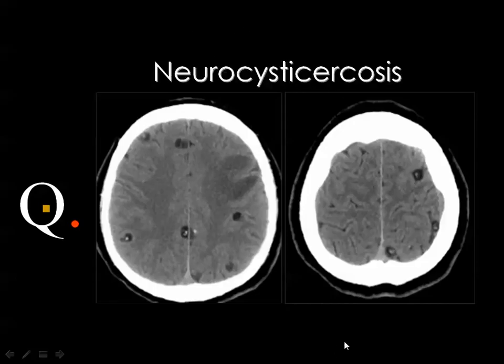And it is enough to see the dot in one of the cysts only. Then all the cysts which do not contain dots belong to the same disease.